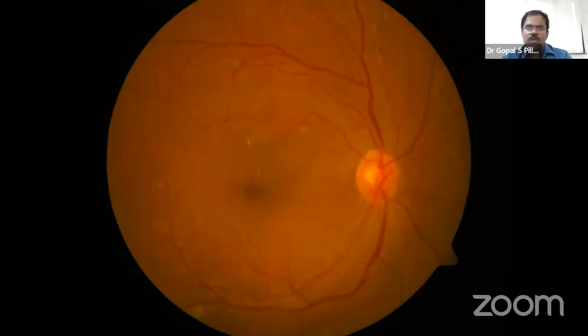Can we have a diagnosis here? The format that we will follow is, we will have 2 or 3 key findings of that particular picture, and then a probable diagnosis. Then we'll go to some theoretical aspects of it. Why did you make that diagnosis? What are the differential diagnoses? You can reverse it also: you can say what the findings are first.